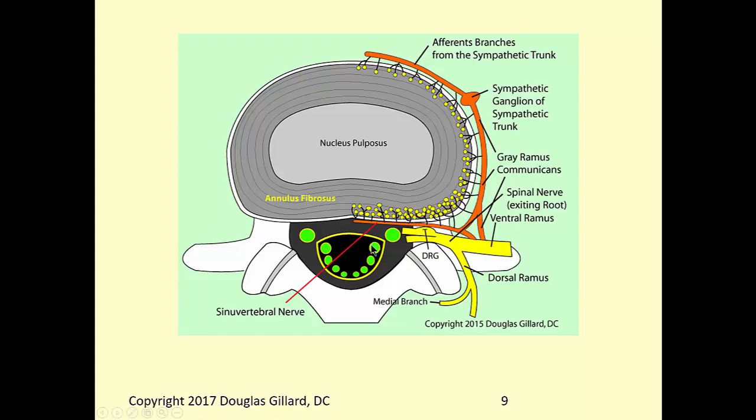These are the traversing nerve roots. This is overhead, a cross-section view. So these are the traversing nerve roots of the cauda equina, right? Horse's tail. And they often line up really nicely like this because they have to bud. They have to come out to do their job. They're hanging out here having a good time being bathed in cerebrospinal fluid, which brings them food and takes away their waste. But when it's their time to work, they come up to the corners here and they actually rip right through. Well, they don't rip, but they bud off.